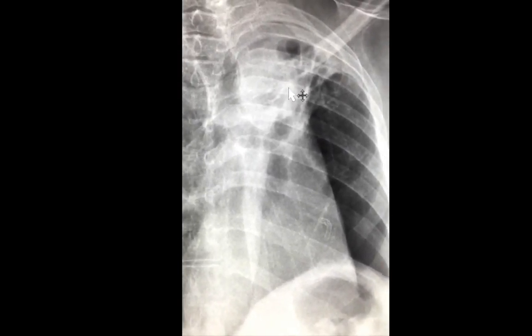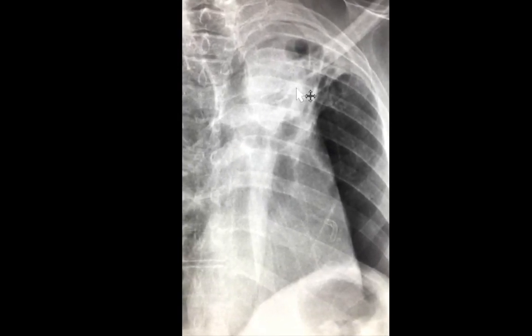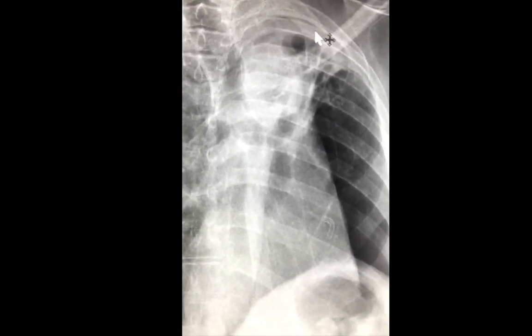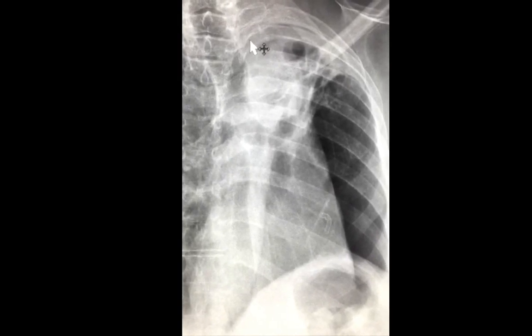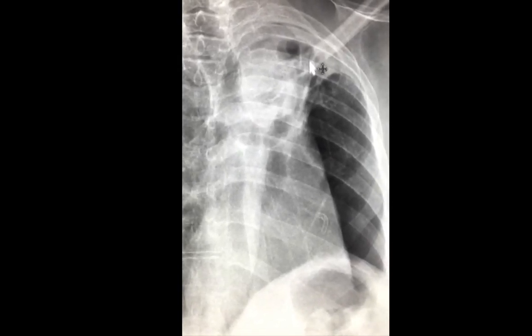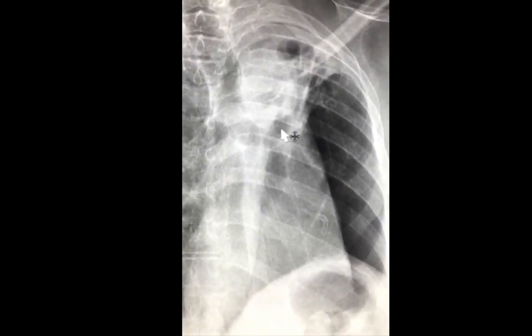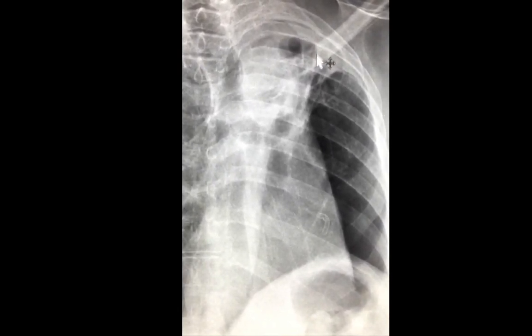The general rule is that you should not miss collapse, since in adults, collapse may represent compression of a bronchus by lung cancer. However, in this case, the features that we see are suggestive of a chronic nature with some scarring and bronchiectasis. And when this was compared to a chest radiograph about 3 years ago, the appearance has not changed. So the overall diagnosis in this case is chronic scarring and bronchiectasis with total volume loss in the left upper lobe, which is likely secondary to an old insult such as an infection, and in our region this is commonly related to old TB.